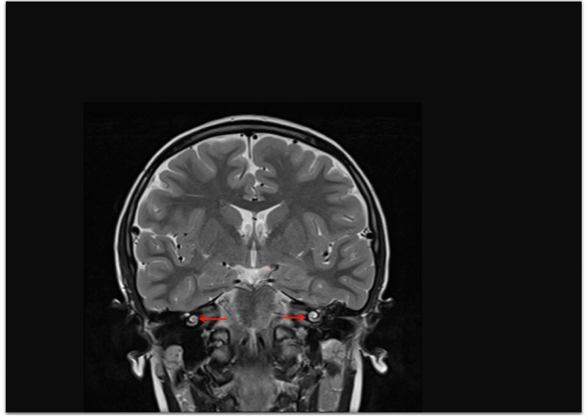Nerve fibers within the cochlea, demonstrated here, mediate perception of sound and have a cortical projection to the superior temporal gyrus after those fibers make a synaptic connection at the medial geniculate body of thalamus. So why are the cochlea bright on T2 weighted imaging?